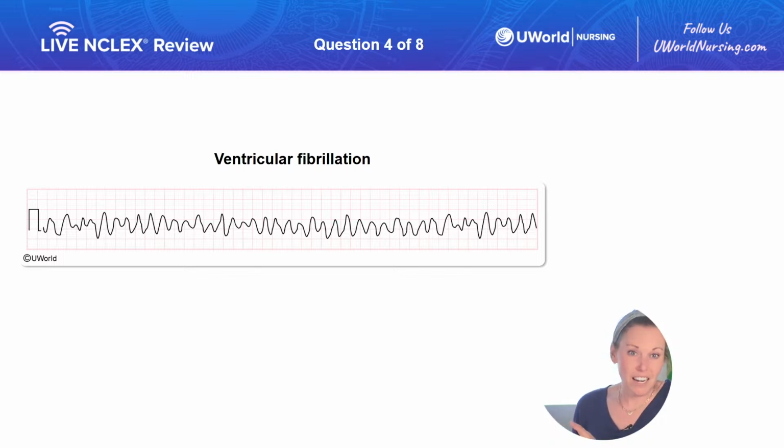You guys did great on that one, but remember, VFib is the life-threatening dysrhythmia. Our heart is not squeezing appropriately. We're not perfusing our body. We have a lot of intervention to do when we see this.